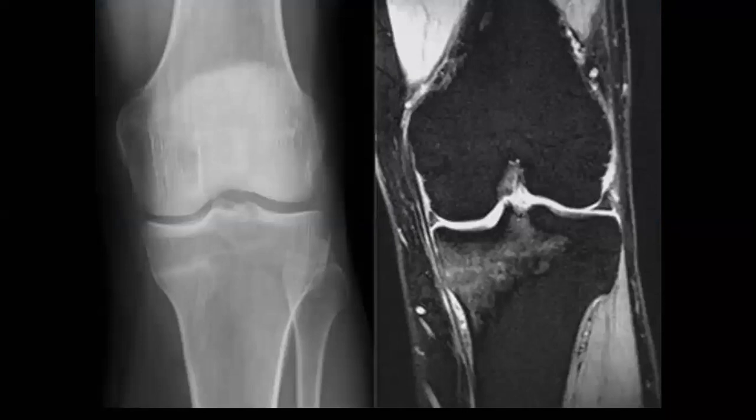Let's go further and try to find this. So when you find this appearance, a good differential is stress fracture, and check if this patient has an X-ray of one of the sites of stress fracture. And SONK is one of the good differentials, especially if the patient has a history of meniscal surgery, and the age also. So insufficiency stress fracture is one of the good differentials. They like it in the exam, stress fracture, insufficiency fracture.